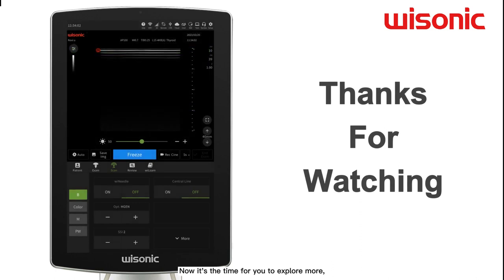Now is the time for you to explore more. Watch the instruction videos online or refer to the user manual.